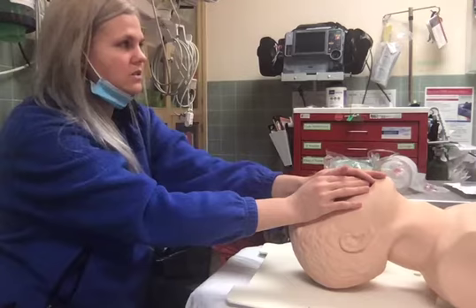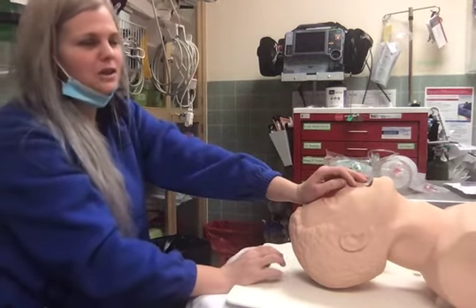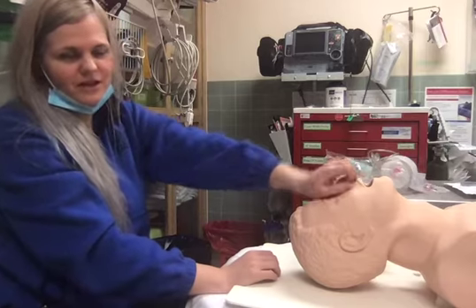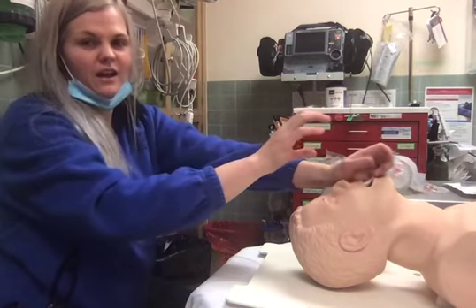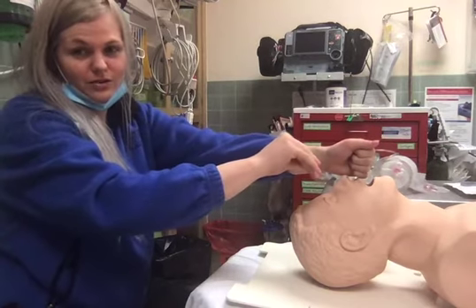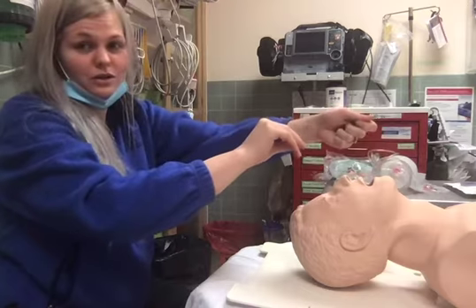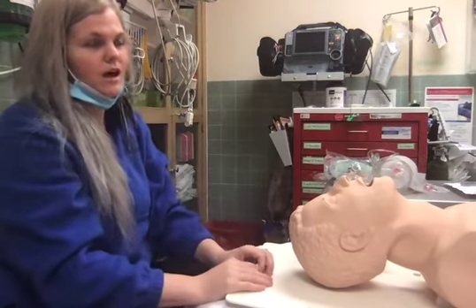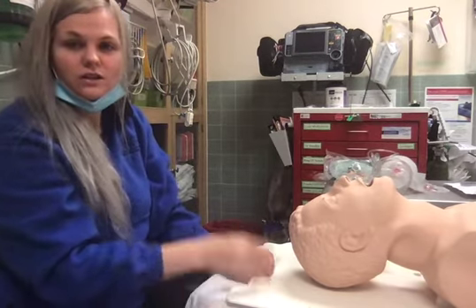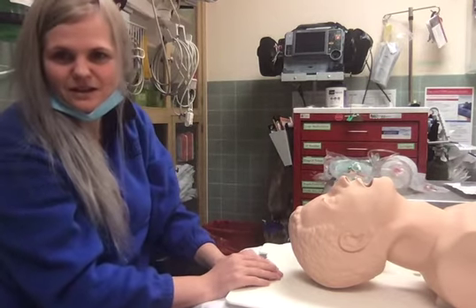If you're not getting chest rise, rather than taking it out and trying again, you're in the right spot. You just may not be in the most optimal spot. So as you are ventilating, if you are able to kind of pull that King tube out, once you're able to ventilate or compress that BVM bag, then you know that you're in the right spot. At that point in time, if necessary, you can add a little bit more air to secure that airway. But otherwise, it was just kind of a neat little trick that I had found.